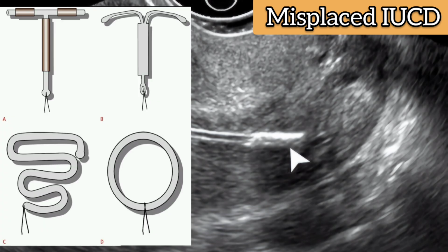These are four different types of intrauterine contraceptive devices. At number three is the double S shape, but this was used in the old days, like the 1960s to 1980s. At number four are stainless steel rings, which were used before 1993 in China, and nowadays T-shaped intrauterine devices are usually used. Like these levonorgestrel-carrying T-shape, and the copper T are widely used.